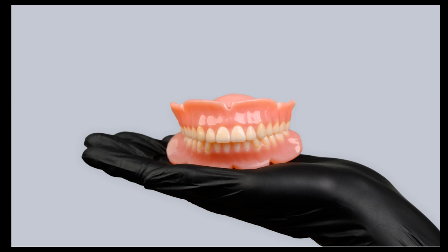You can arrange at this point or later. Sometimes it's helpful. For me, it's nicer to arrange at this point because it's easier to see all the teeth are facing up, and I can see everything much clearer.